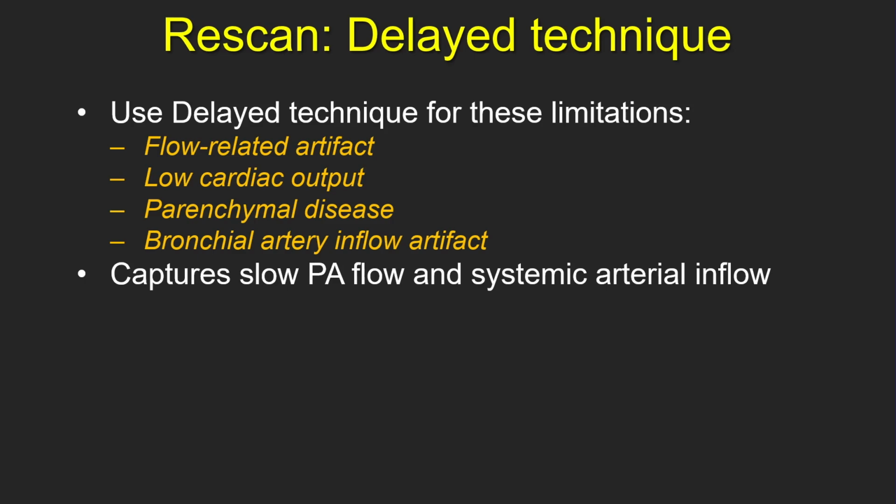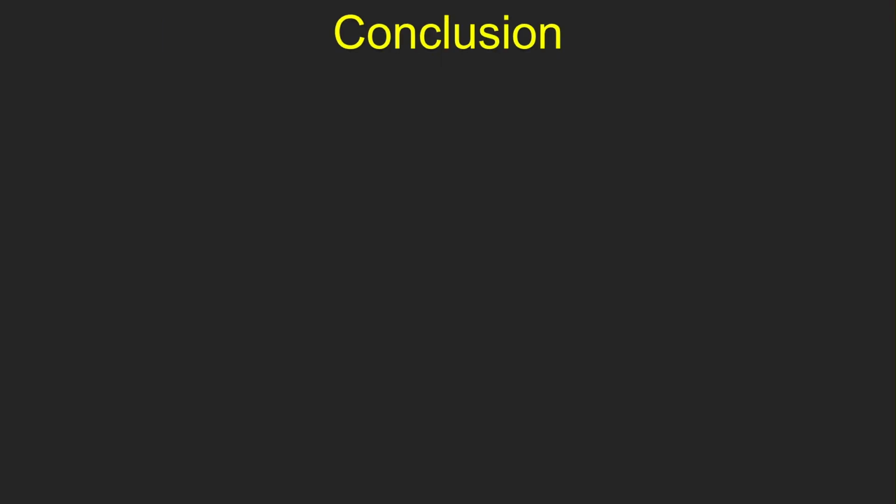On the other hand, you can use a delayed technique for these limitations: flow-related artifact, low cardiac output, parenchymal disease, and bronchial artery inflow artifact. Delayed phase acquisition can capture slow PA flow and systemic arterial inflow into the PAs.